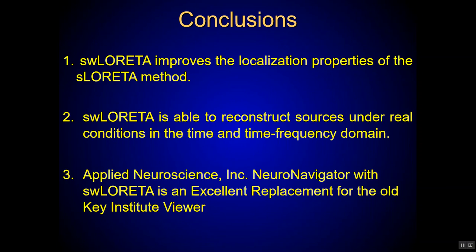advancements. So what I'm going to do now is take you through the NeuroNavigator. We're going to start with a patient, and we're going to step through it and try to answer questions about how you use the NeuroNavigator. We're going to do it in two parts. The first part is going to be in the current density itself. That is just how much current is being generated in different parts of the brain. The second is the tools inside the Navigator that allow you to evaluate functional connectivity. That is the degree of coupling between Brodmann areas, both for coherence and for time differences or phase differences.